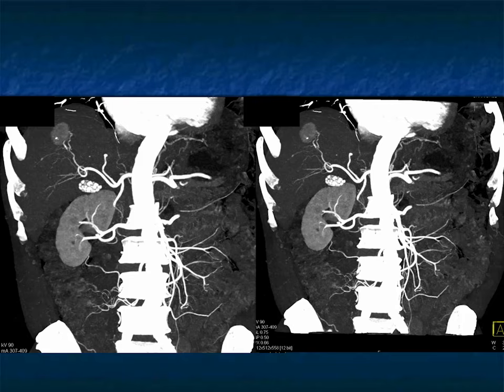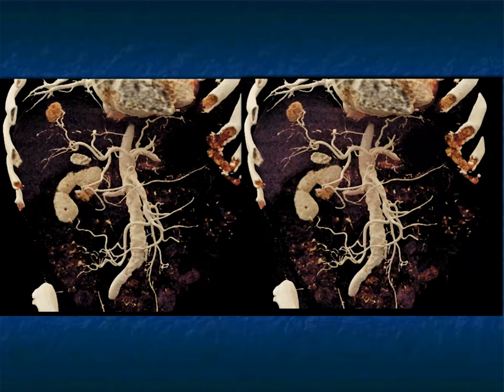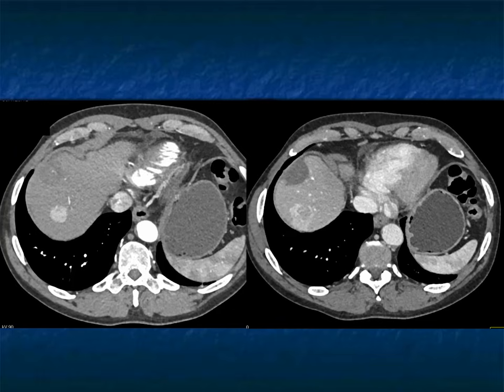And here's that lesion again. You can see the prominent vessels leading to the lesion. Not very helpful. Here it is also on the cinematic display. Again, not awesomely helpful in that regard. I'm still worrying this is not hemangioma. And then when I get the washout, you can see the lesion washes out centrally, but there's peripheral puddling. It's kind of the reverse.